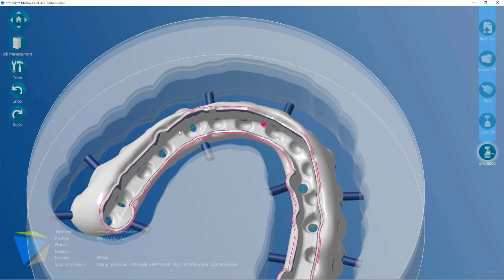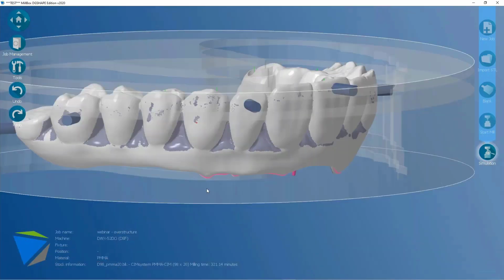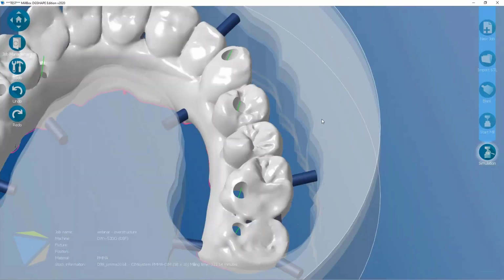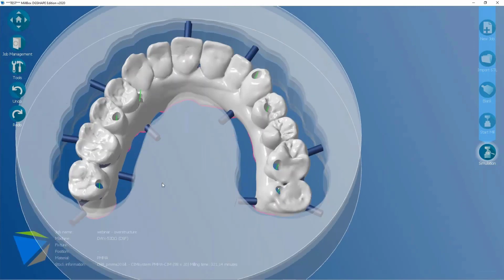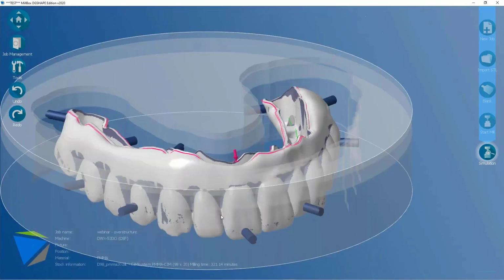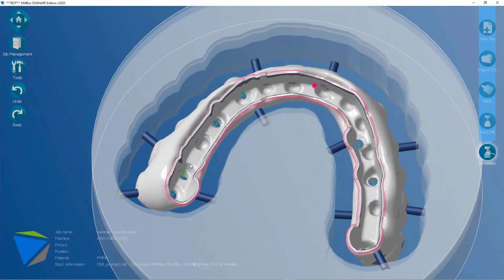And then it would be much more convenient and easy to use. Here, automatically, graphically, we can see something. For example, the green lines here in this case are representing the insertion axis for the holes. Okay, so here it would be easy, even at first look, to detect the crucial part of this element.